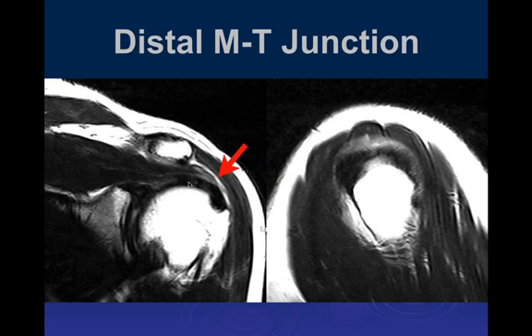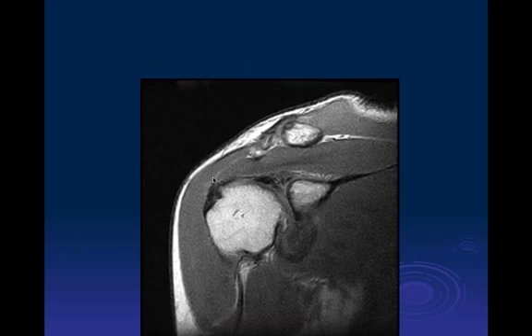And as long as his humerus was abducted, he didn't have any symptoms. So I think this is a real phenomenon, but it's pretty uncommon. But it's just something I think you should be aware of, and that's the distal musculotendinous junction. I've only seen one case that I operated on, John. Yeah, really? And you did an acromioplasty for it? The patient couldn't bring his arms down.